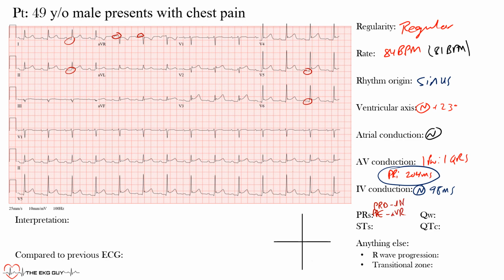And there's almost diffuse PR depression in some leads. So notice it here as well, here, okay? So in most leads, we'll say that, not in all. So that's one thing to note.